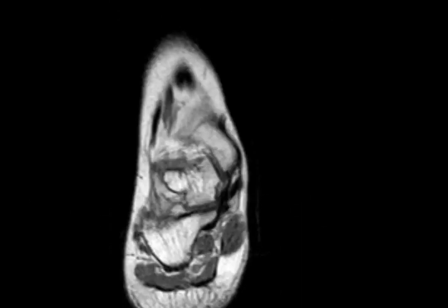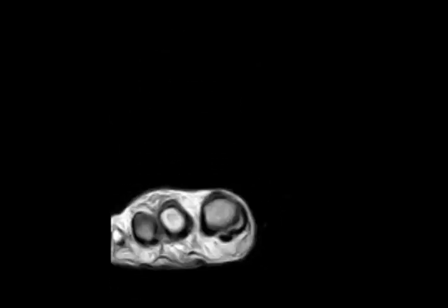Extending distally into the toe itself, the second toe also shows peripheral soft tissue swelling and edema, and the third toe also shows peripheral soft tissue edema and swelling, and the bone shows normal signal intensity, indicating it is not involved. You can confirm it by looking at T1 weighted images, because T1 is better for anatomy, and you can see the bone is relatively preserved or intact.